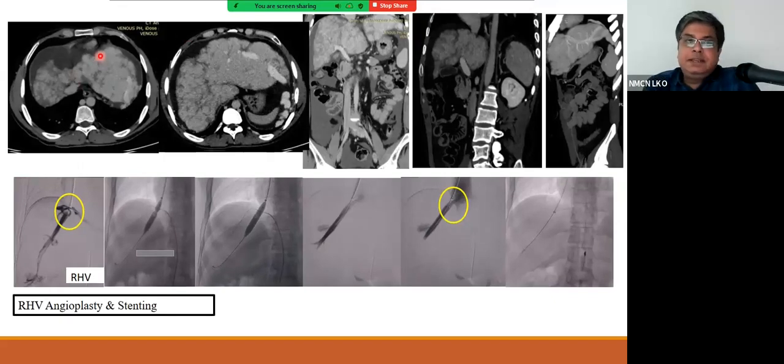So here we can say a heterogeneous liver with nodular outline, non-visualization of hepatic veins, and large hepatic and perihepatic collaterals and perisplenic collaterals. And here we can see also this small esophageal varix. This can be also visualized in these oblique reformatted sagittal images. And these are hepatic, perihepatic collaterals. At the same time, we can appreciate also this ascites.